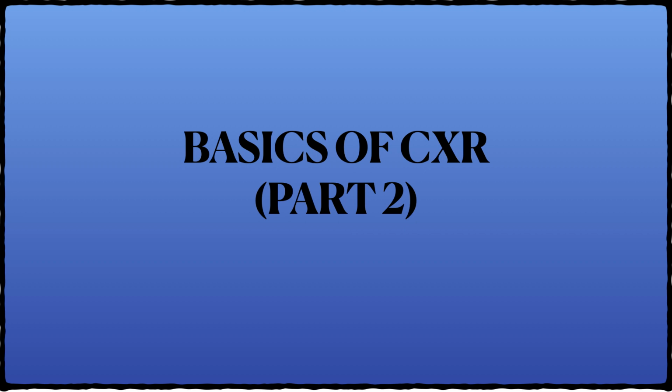Hello everyone, today in our video we're gonna understand the main steps that should be followed for reading chest x-ray, part 2.